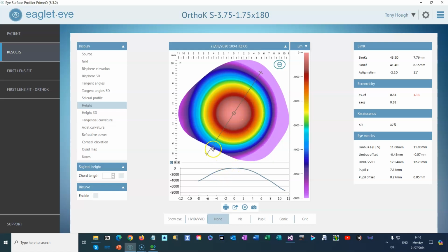because I note in passing that when I have an area in the twiddler which is outside of the map raw data, then I do not show anything. So that's important to note and remember. I also note in passing that I cannot tell the difference between the ends of this twiddler, because this end is a cross arrangement, and this end is a very identical, to me at least, cross arrangement like that.